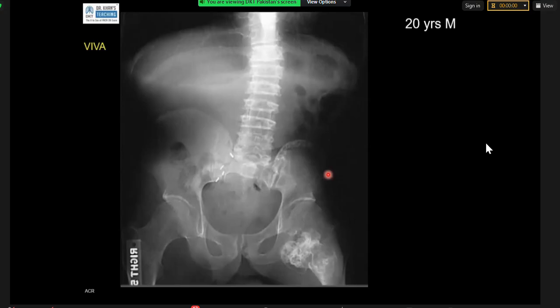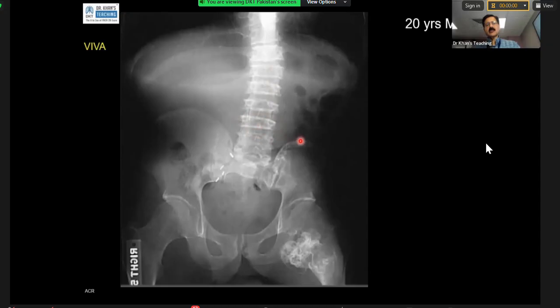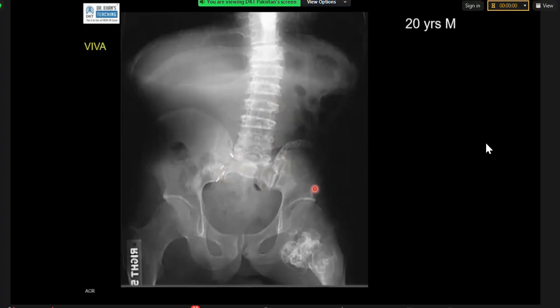I can see now that the sacrum is not presented in these vertebrae. Something. What is the difference between this side versus this side? I think there is a decrease in the size, a decrease in the height, in the left side in comparison with the right side. Excellent. So how do you correlate all of these things with this? Maybe a congenital disease.